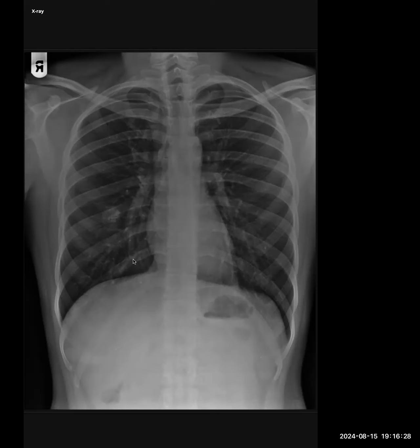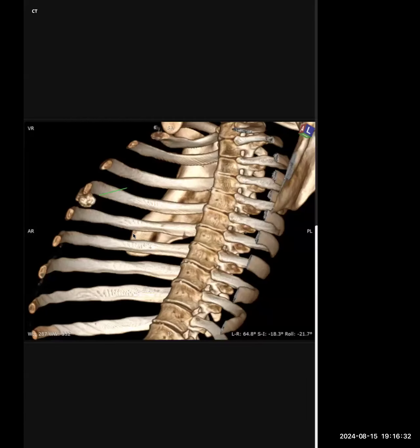Apart from that, you did well to describe it, but you know the answer now, that this was actually an osteochondroma arising from the rib. And in terms of what to do with it, when I asked you that, you did mention the MRI and the cartilage cap. You could also add that you'd review the previous images to see how stable it has been over years or months or weeks, whatever.